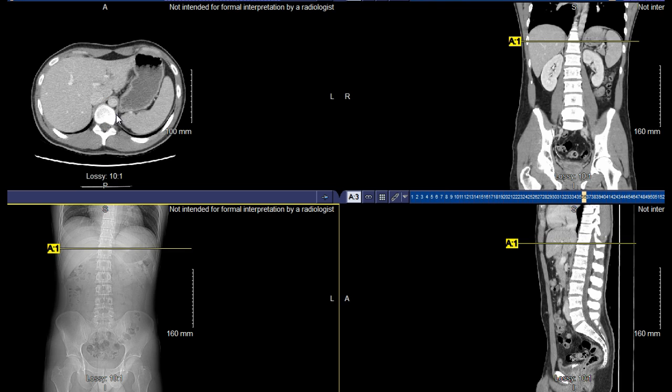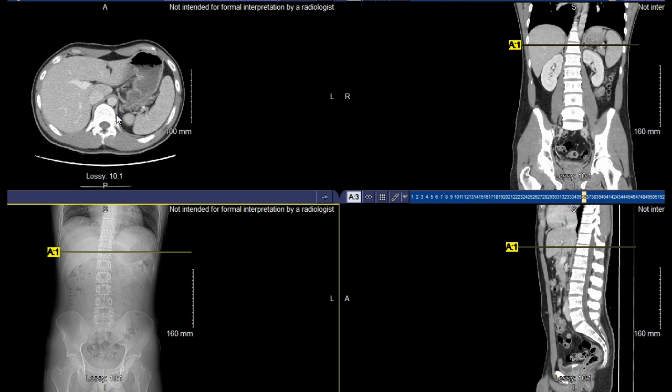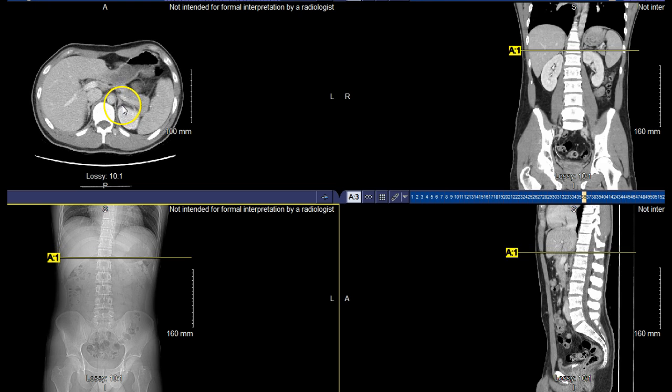glands. So the adrenal glands on both sides respectively, typically we can expect to see the left one as we pan down before the right one, just because of the proximities and respective positions of the kidneys. So you can see right in here is actually the start of the renal artery. So just kind of want to go in and out with the mouse so you can see that. Adrenal gland, I'm not sure if I said renal artery there, but it's the adrenal gland itself. So we can see that kind of triangular pattern right in through here. We can be able to see that.